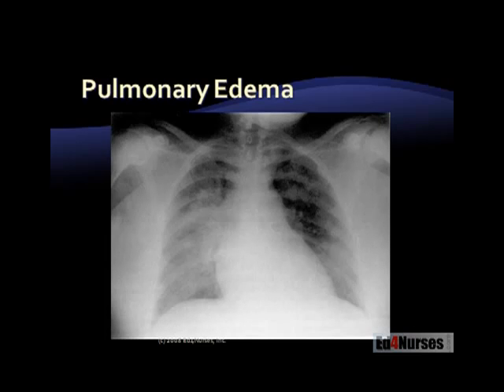This is a patient who has pulmonary edema. Going back through our 5 steps, the first thing we do is assess for lung expansion. Now you see the nice diaphragmatic arch on the left-hand side of your screen, which is the right lung. You see that nice diaphragmatic arch? That's what we should have seen on the previous slide. So here we have a nice diaphragmatic arch.